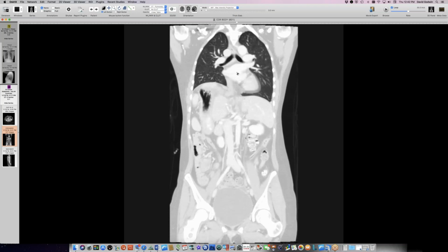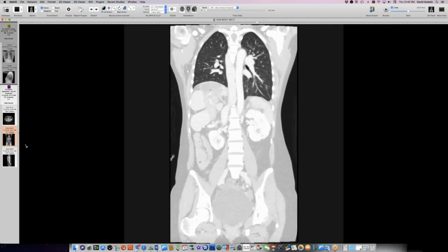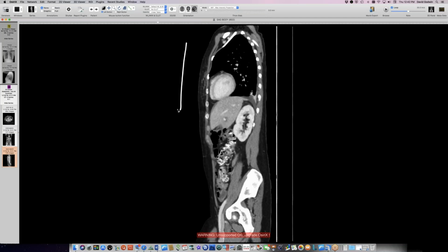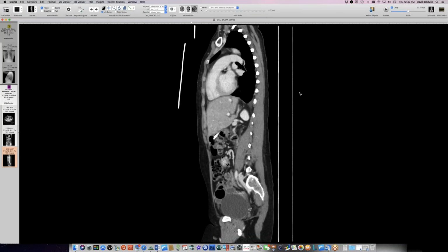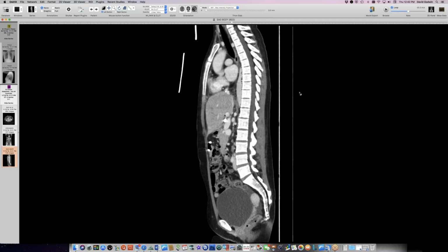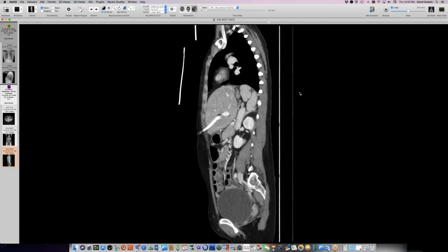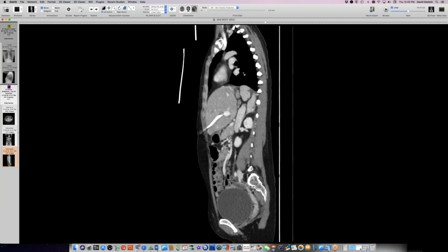The pulmonary artery on the right is going over that bronchus, so that is an additional hyparterial bronchus on the right. Let's check it out on lateral. So here we are on the left, and here is the left pulmonary artery going over its bronchus. Okay, let's continue across the mediastinum, which I think I'm doing here, and I see the right pulmonary artery, and it doesn't actually seem to go over the bronchus in quite the same way. But the bronchial system is messed up on that side. It is, yeah.